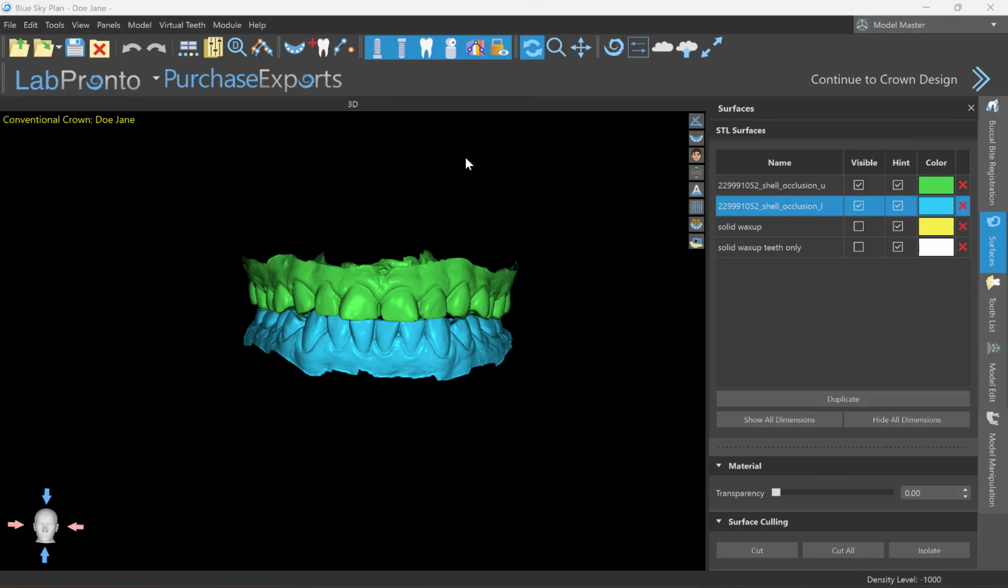So, had a customer call me. They were wanting some help with how you would pull this off, and so I just asked them to send me a case, and thought I'd just make a video for everyone real quick.